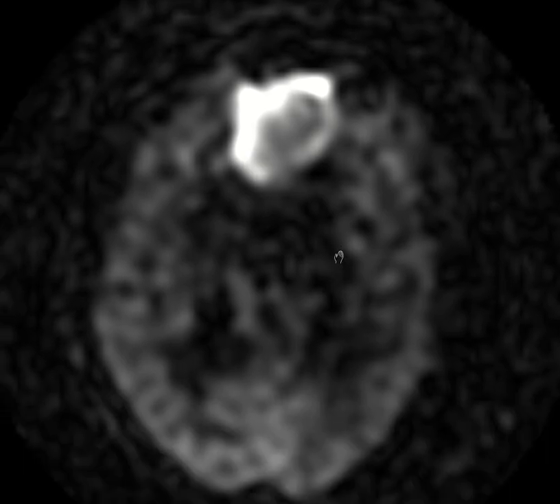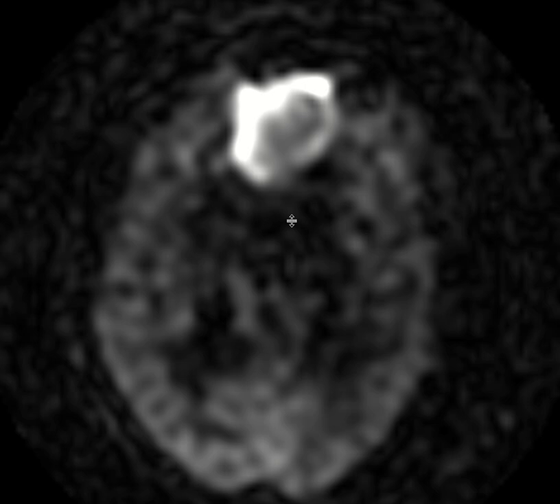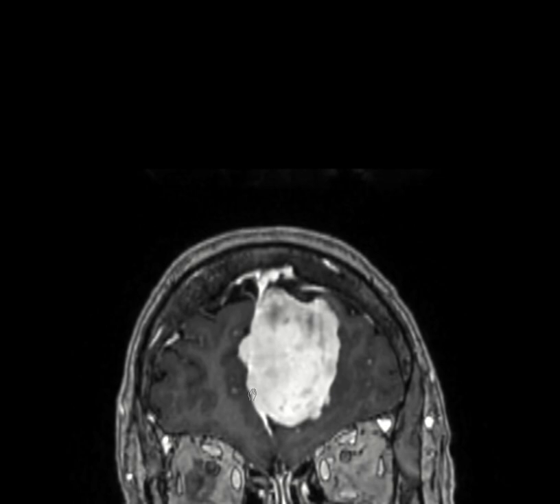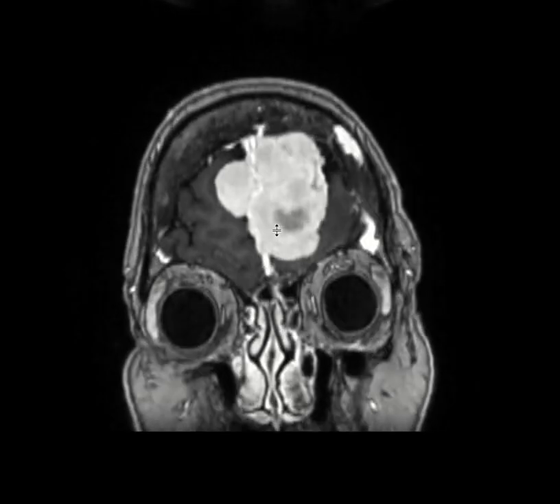Here we see the arterial spin labeling, or ASL, sequence, which is a perfusion technique without contrast administration. This is a very useful imaging sequence that gives us a lot of information about shunting, AV fistulas, and different tumors, like tumor progression and recurrent tumors. You see that this is a very characteristic look for meningioma: they are bright on ASL, so it doesn't mean anything bad. Meningiomas are usually ASL bright, hyperperfused, and very vascular, and as you see here, we see enhancement with some areas of heterogeneity inside when they get very big. There are some areas of central necrosis.